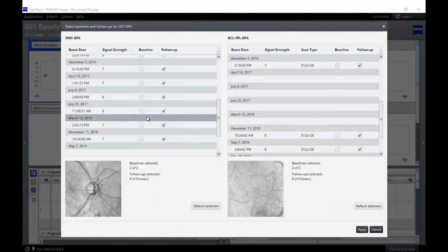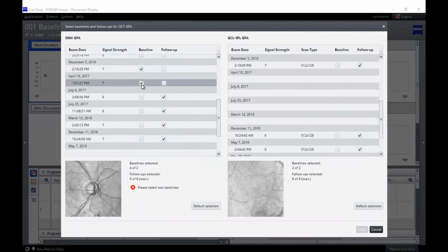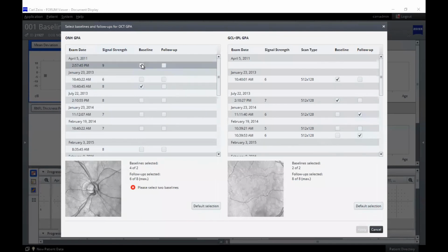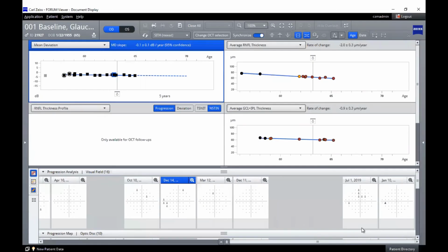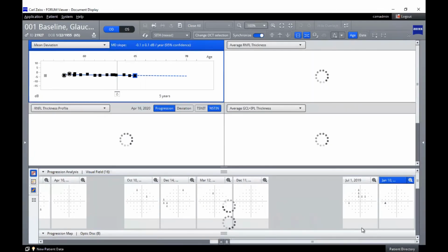That's what I want to look at. And so sometimes I will kind of toggle back and forth. I'll look at a GPA using a baseline of 6 years ago, and then I'll just change the baseline to my most recent intervention and see what those rates are looking like, because that's really how I can decide if my intervention has made a significant impact.